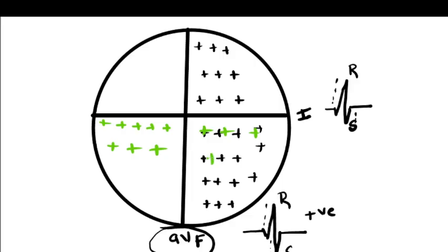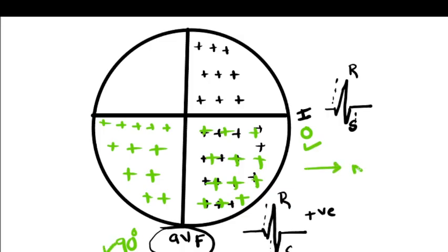All right, so from this figure it is clear that there is a common area between 0 and 90 degrees. It means that the axis is between 0 and 90 degrees. That means it is normal axis. So this is how we determine the axis. Find lead 1 and aVF, do R minus S, and shade the half of the circle that is near to the lead if it is positive, and far away from the lead if it is negative, right? So let's take a few more examples and do this exercise.